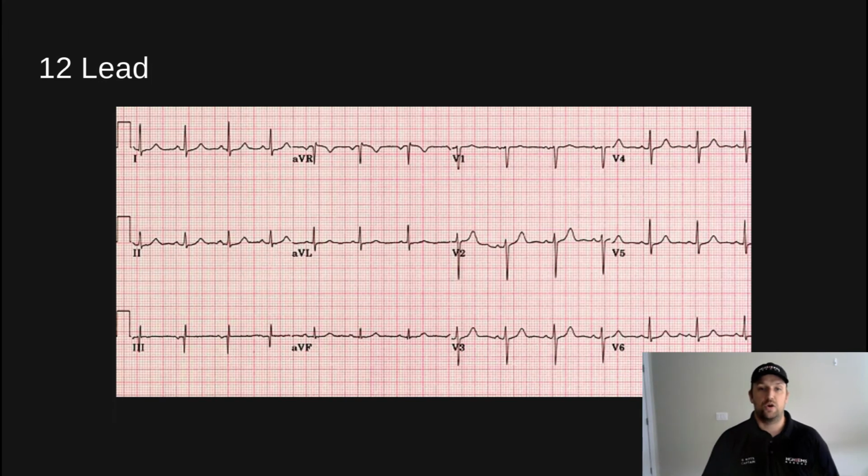Now I'll do an example 12 lead interpretation. Step 1, AVR evaluation. AVR is negatively deflected, so now I know I can interpret this 12 lead. If it were positive, I would stop and check my limb leads. Next, go to V1. This 12 lead is a great example. In the V1 tracing, the amplitude of the P and the T wave are very small, so it's hard to see them. So what you can do is go down to the next V lead, and in this case V2 is very clear, or V3, either way. So we'll use V3. V3 has a clear P wave, then a clear QRS, then a clear T wave.